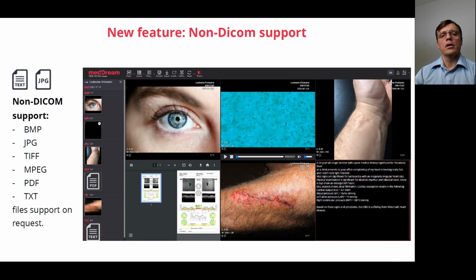So when the informational system asks us to open some study like an X-ray image, we also pass in combination the data surrounding that study, like some reports or something in PDF. This is a very innovative way to do it, and it will take some time for them to integrate and create the plugin. But this is one of the options.